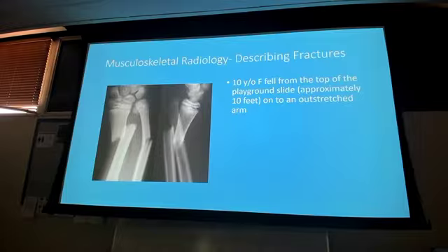All right, first of all, let's go simple. Which bones are fractured? Radius and ulna. All right, beautiful. Which one is just the simple transverse fracture? Radius. Right there. How else could we describe that? Shortened. I like it. Let's go with the easy terms, right? So we got a simple, transverse, shortened radial fracture. You described everything you need to for me for it. Good job. Now let's go to the ulna.